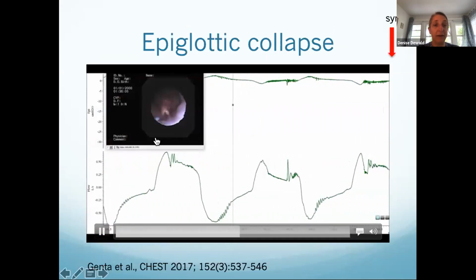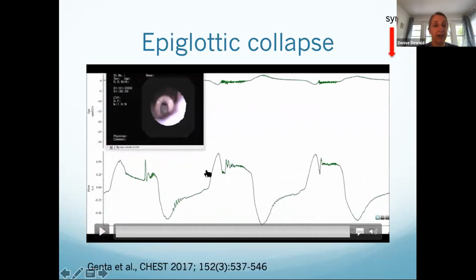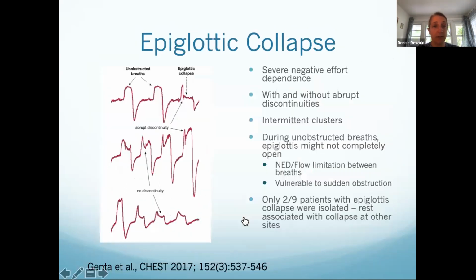And now that's an impressive one. This guy's breathing through a straw. And so here you have this sort of bad negative effort dependence and these abrupt discontinuities.